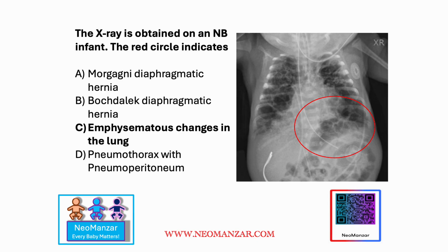So basically what is happening here, let me make it clear. Let's draw it. You see the cystic change in the lung here at the bottom, at the base, and this is the intestinal loop, either the stomach or the small intestine, overlying that. And you see there is no communication, so this is not diaphragmatic hernia. You see the diaphragm in between, so the diaphragm is all intact, so there is no diaphragmatic hernia.